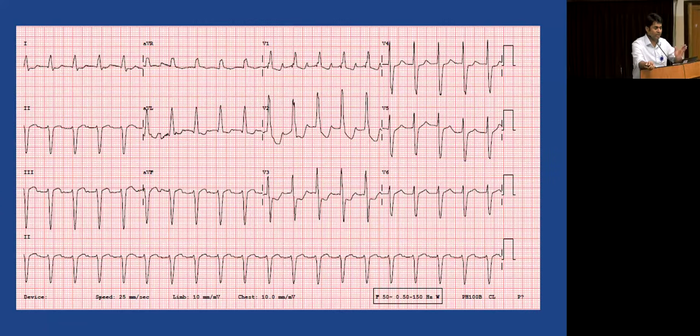Now, if it is 1:1, let's say, what RP tachycardia is this? It's falling right in the middle, right? Just around that. So when you have this right in the middle, it's neither in the first half nor the second half, and we call it, this is not an official term, the mid RP tachycardia. The implication is that when you have a P wave right in the middle of the RR interval, always suspect that there is another P wave buried within the QRS.